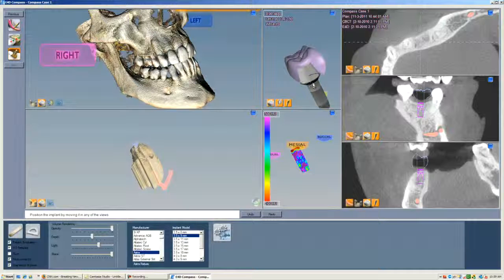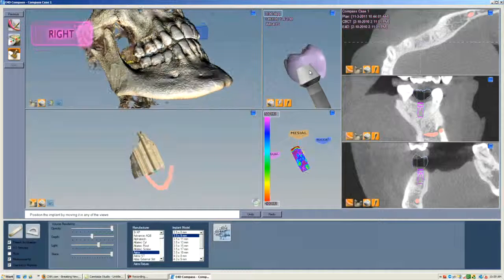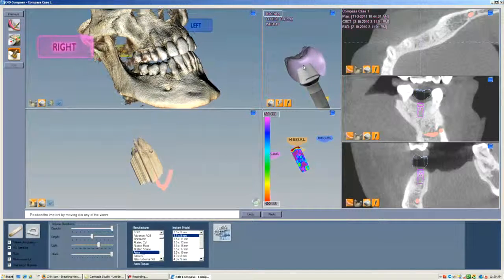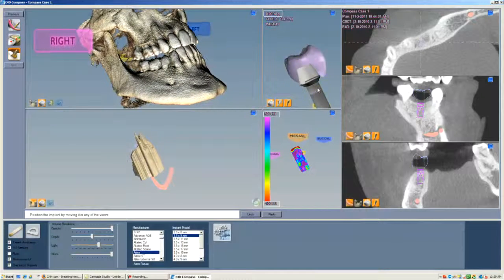Are you right-clicking, Glenn, to do that? I'm right-clicking to move my model. And then to select it, I'm left-clicking in that area so that it can grab it. So if I click there, I want to click on this cone height, and I want to raise that as well.